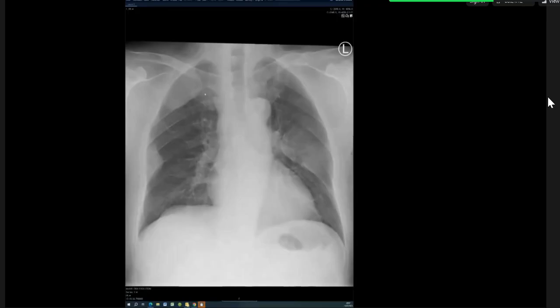Yes, the second rib is missing. So I suspect that there is destructive bone changes. Also in the left mid zone, there is an absence of the rib. They're suspicious of bony invasion. So this further reaffirms my diagnosis of a sinister process of malignant pathology, likely mesothelioma, being the most common cause.